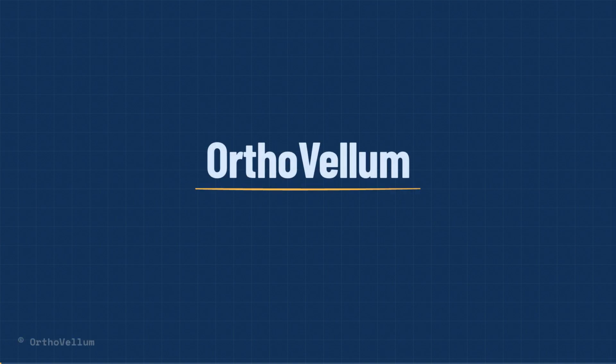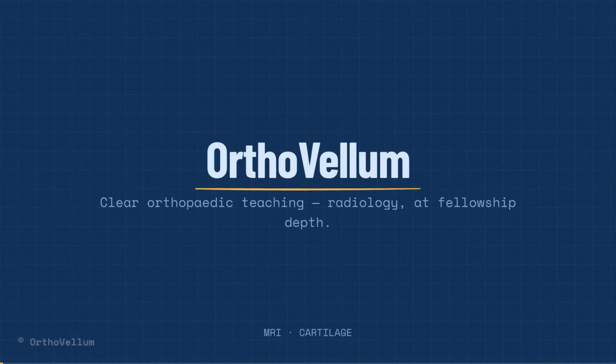Articular cartilage is 2 to 4 millimeters thick, avascular, and cannot heal itself. Every defect tends to progress toward osteoarthritis. So MRI is how you grade it, plan the repair, and follow it. This episode: the sequences, the grading, and measuring the surface you cannot heal.